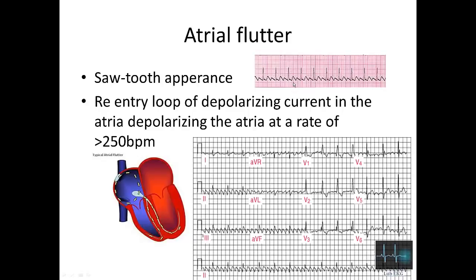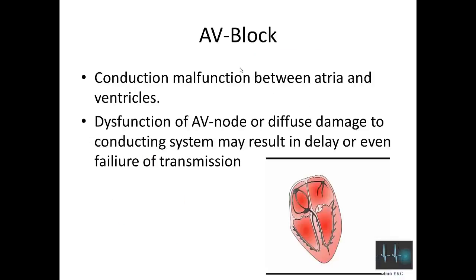So basically, if you have a tachycardia which is very fast, over 160, always just think that this might be flutter. But look for the characteristic sawtooth appearance.